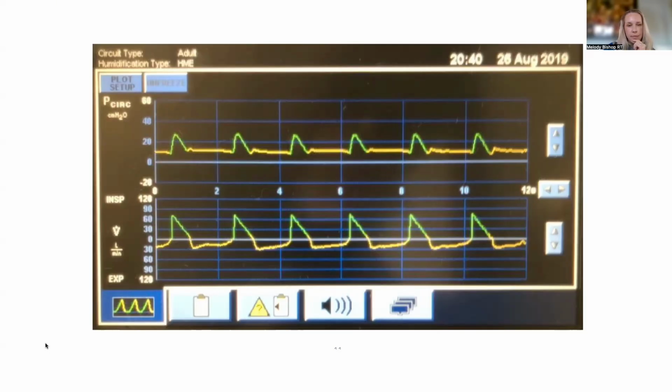So I think the point of this is that we're going to look at these waveforms and then talk about how we should be fitting the ventilator to the patient if we can, and not reverse, trying to fit the patient to the vent. Now, there are specific situations where we have to fit the patient to the vent, i.e., a low tidal volume strategy, or if there's incredible obstruction and you have to drop the rate to like 4 or 5 or something crazy, and the patient obviously is not going to like that. We have to do certain things to allow the patient to be in the passenger seat a bit while we drive, while the patient goes through their acute illness. But outside of those situations, we should really be trying to make the ventilator fit the patient, what the patient wants or needs. So that's going to be the goal of this, I think.